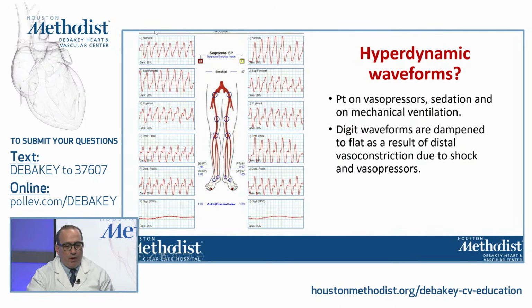Here, the waveform morphology kind of loses. I like to compare it to something visual, almost like a VTAC segment. And I consider these almost hyperdynamic waveforms. If you look at the toe waveforms, they're almost completely absent. And this patient is on vasopressors, sedated, on mechanical ventilation.